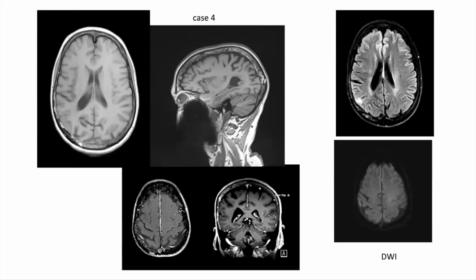All right, let's look at this case. So here we have a finding on the right side. You can see the normal, this is a T1 weighted scan, and in the diploic space, there's usually some fatty marrow, which gives you this high signal intensity. Again, you see the high signal intensity here, high signal intensity here, although it's a little odd looking on the right side. There might be a little more enhancement over here if you look at this side and this side.